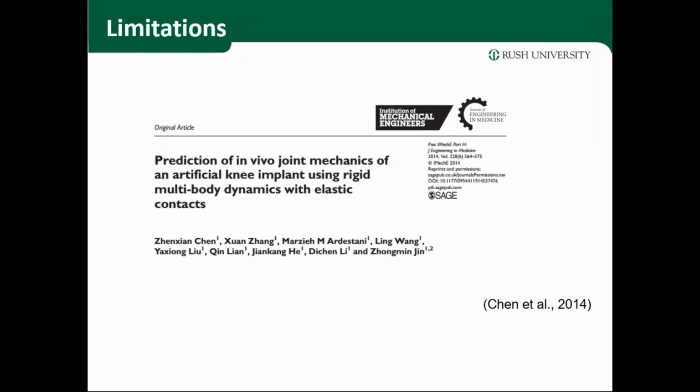geometry of a knee implant. As Mohammed explained at the start of the webinar, AnyBody has this ability that you can scan a knee implant or a hip implant, and then you can have the CAD or three-dimensional geometry of your model, and then you can replace this in the generic musculoskeletal model, so you can replace each joint with a specific implant.